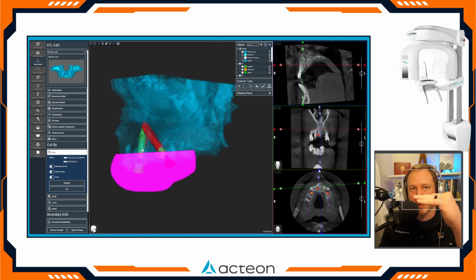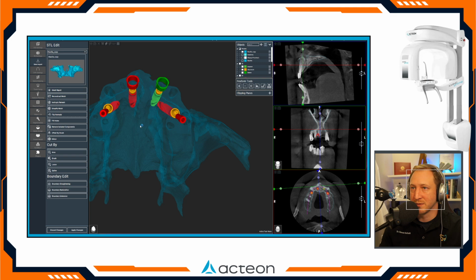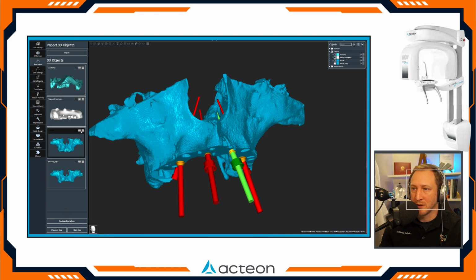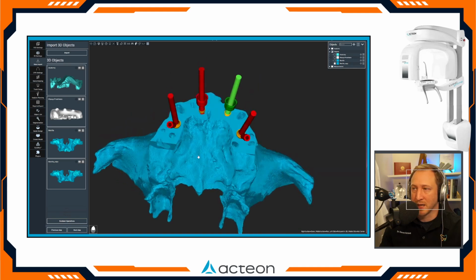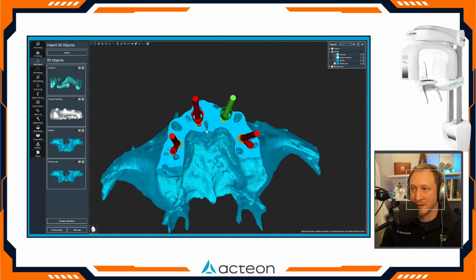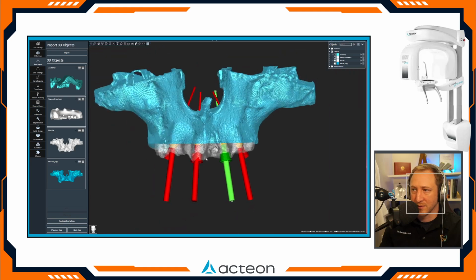You can see all my implants are kind of just above that. And then if you want to come back in the posterior and know you're going to have a little bit of a bevel in the back, we're going to go ahead and cut that out. Okay, and now I have an adjusted model. We're going to hit apply changes. All right, and so now let's see what the final looks like. Let's toggle off our teeth. We'll toggle off the original bone. So now I have this model that I could print, kind of get used to, have access to, and I have an idea of what it should look like when the teeth are out and the alveoplasty is done, versus this model, which we can make, let's say, a different color for fun. We can kind of see the amount of alveo that's planned here. Okay, so that's an idea of how much bone we're going to be reducing in Don's case.